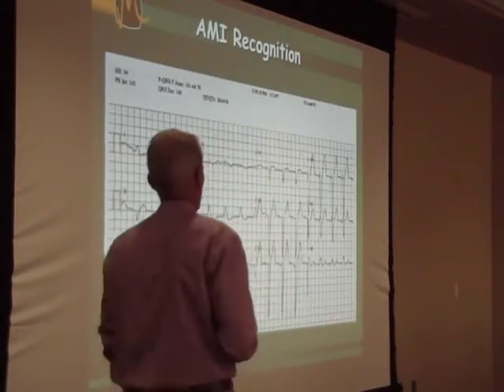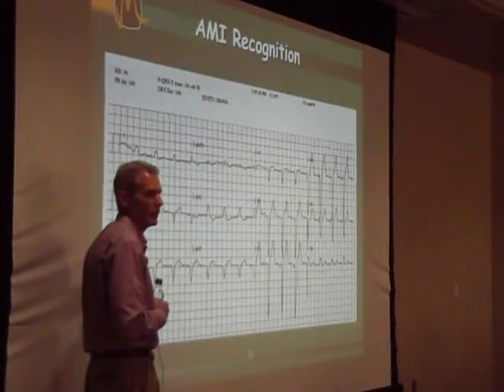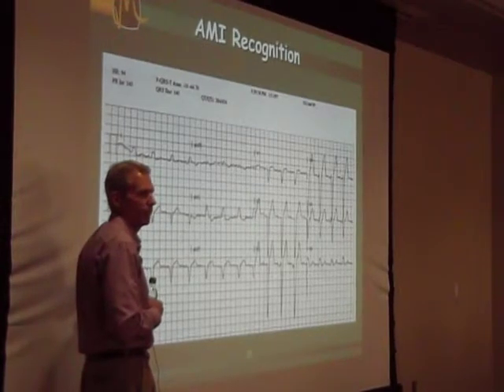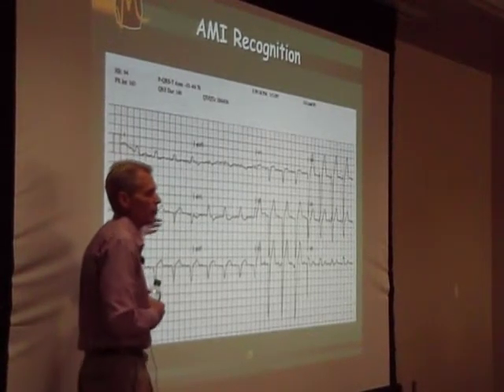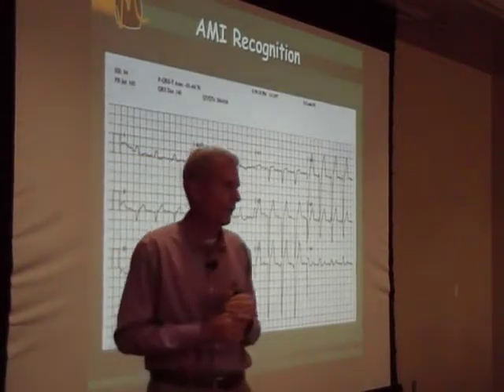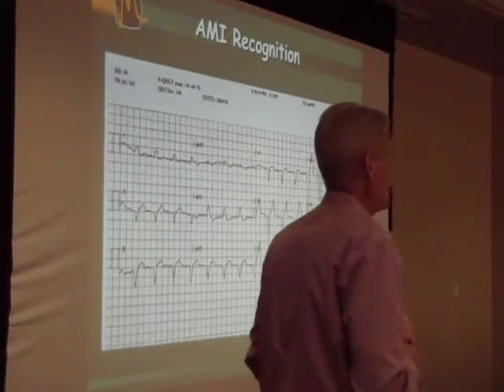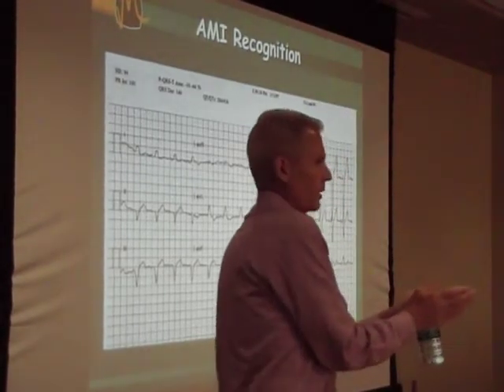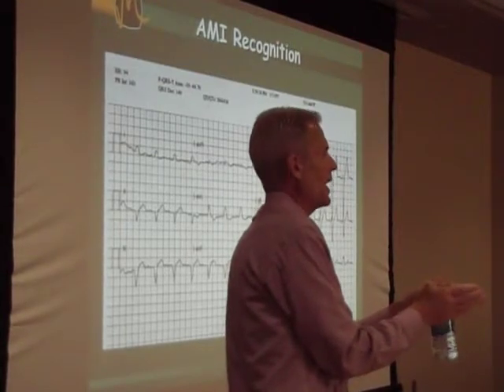What if I told you that this is the patient's normal EKG? There's a pattern present here that mimics infarct, and it's called left bundle branch block. So while we've given you a small part of the story, how to pick up an injury pattern, it's not the whole story.